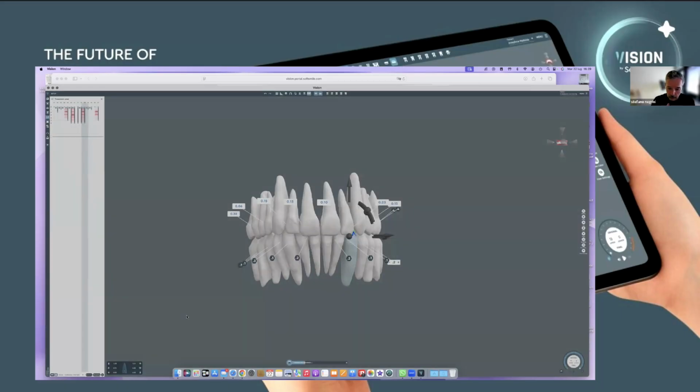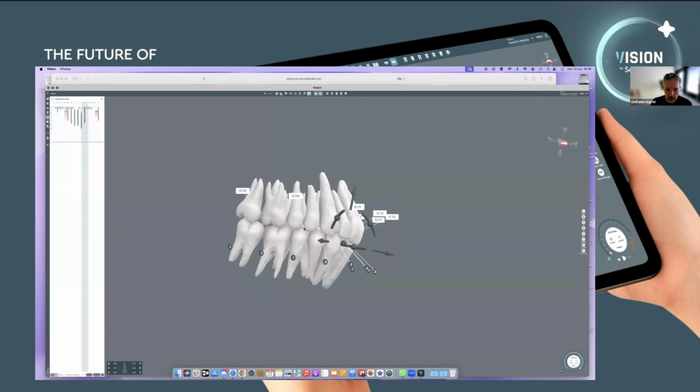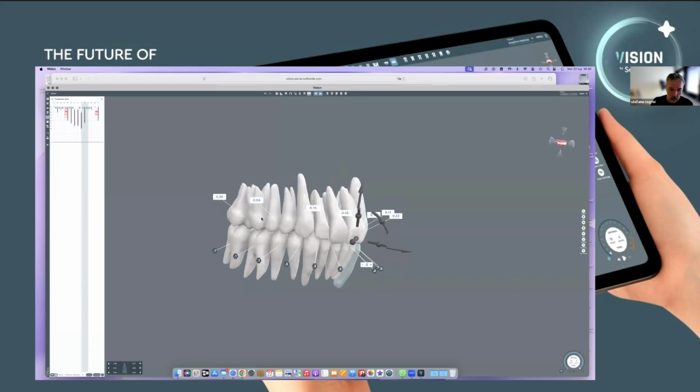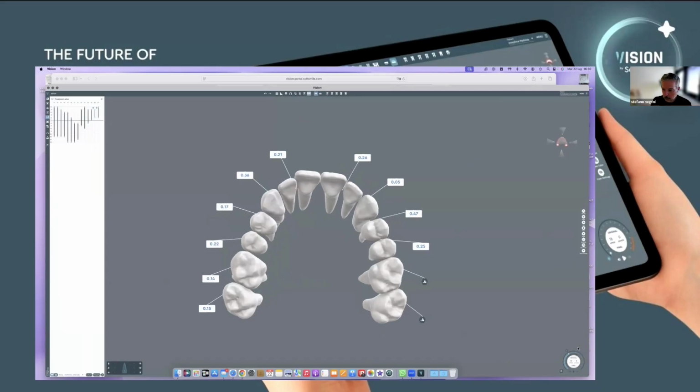Let me check with the auto adjustment, the optimization of the plan. Every time I use the optimization of the plan just to check the difference between the standard plan and 13 and 8. Okay, but now I want to change this one. Let's wait 1 second.